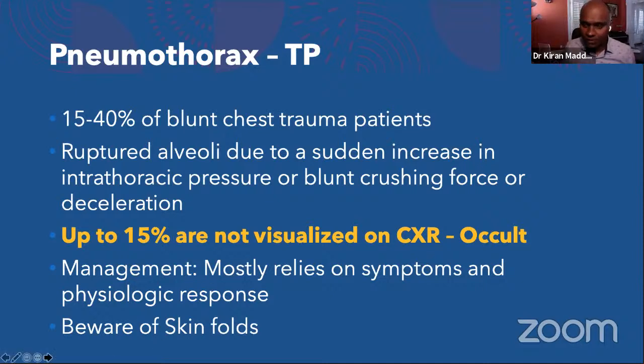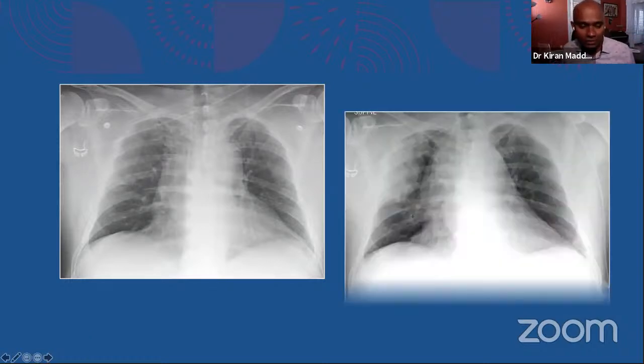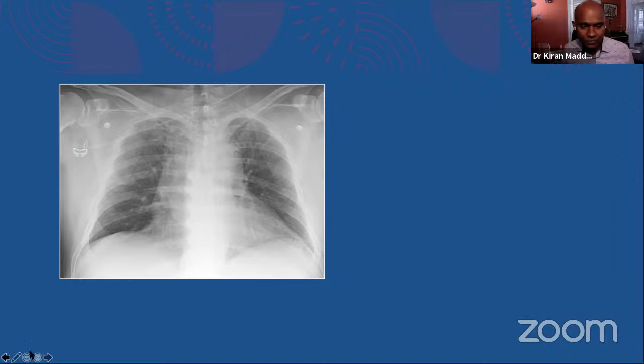But beware of skin folds. Being young residents, you may have to look at the skin folds topic a little bit more carefully, and not to overcall or alert the team saying, hey, I diagnosed a pneumothorax because I listened to a lecture.